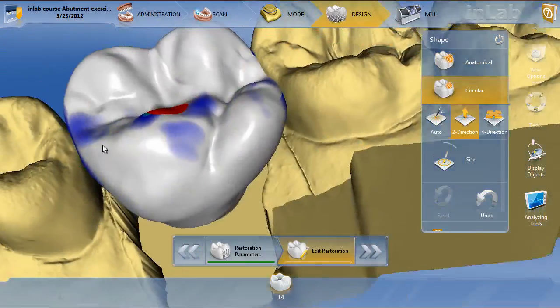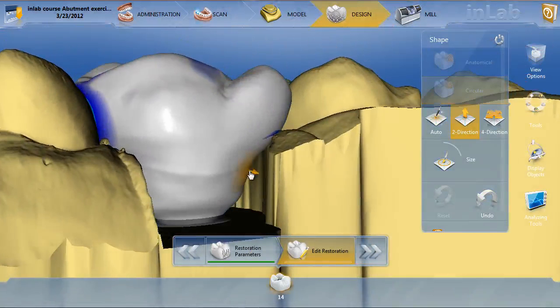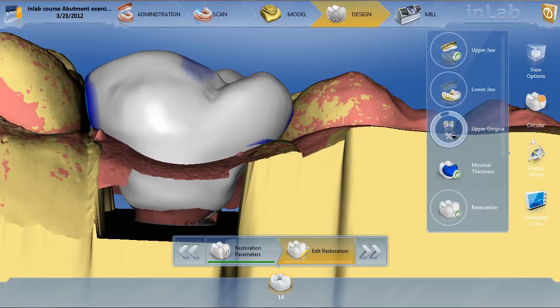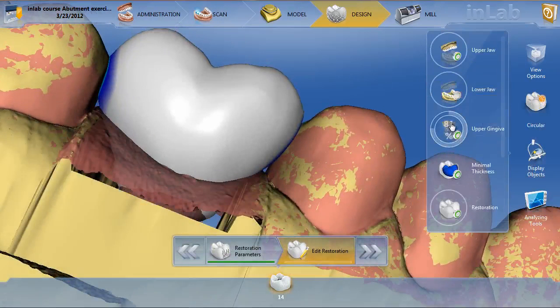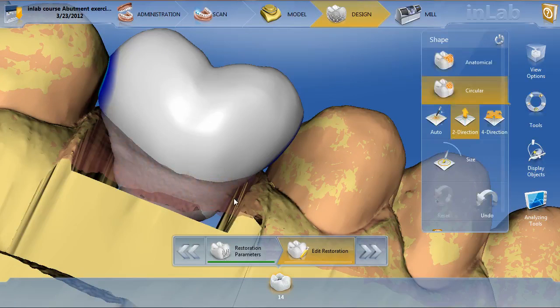You can do it however you would like. Get all these different areas out. Obviously here I would probably get rid of that concavity. And the last thing I would do is put back on my gingiva. I'm going to reduce it a little just so I can see through it, especially on that facial. If there's no pressure on the papilla, it's pink. As I move it forward, if it's all white, you know that this is putting pressure on the papilla. You're not going to have any food traps or any black triangles.